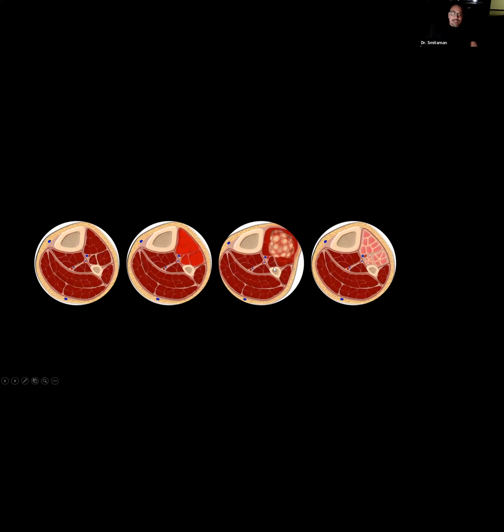Muscle disorders, okay, and the way we look at muscle disorders here out west is we try to group them into four muscle patterns. First pattern, far left hand of image, okay, is the abnormal variant anatomy with normal signal intensity. The second is going to be edema or inflammation. Third is going to be intramuscular masses. And then fourth is just going to be typically chronic, but atrophy and tissue loss.